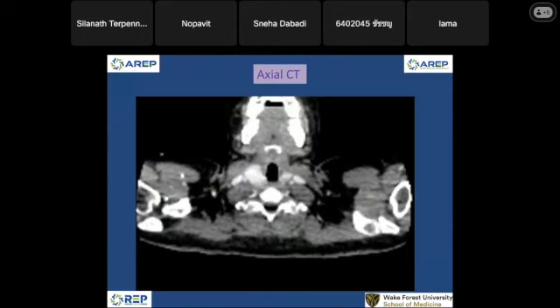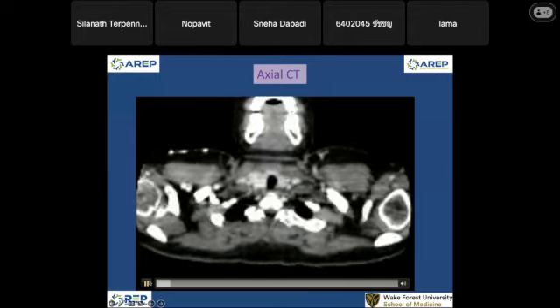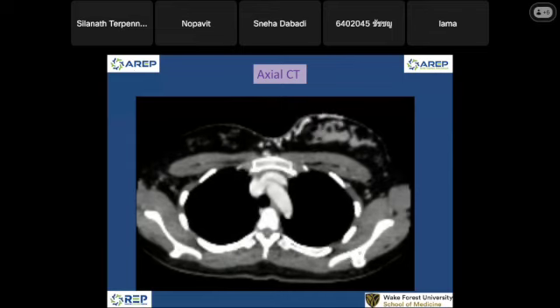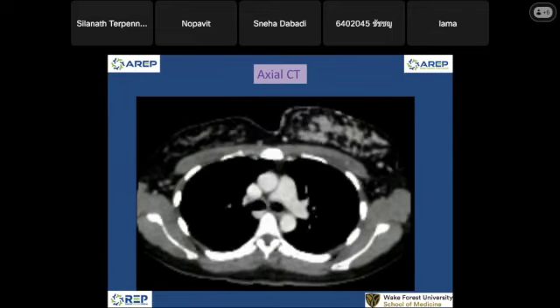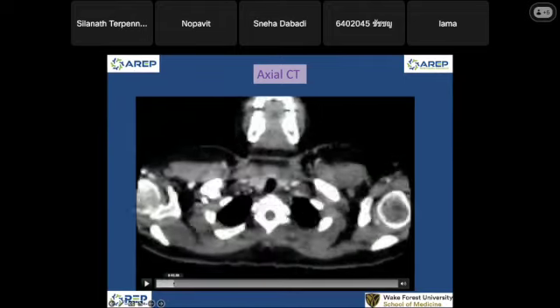Now we're going to look at the raw data. We scan on axial, and we use axial images to do reconstruction. So you are seeing the thing that's already manipulated by the software. But this is the real raw data that we get at the beginning. But I don't have a comparison, because for the chest x-ray that we do, normally we do PA and lateral. Okay, let's look at just normal anatomy here.